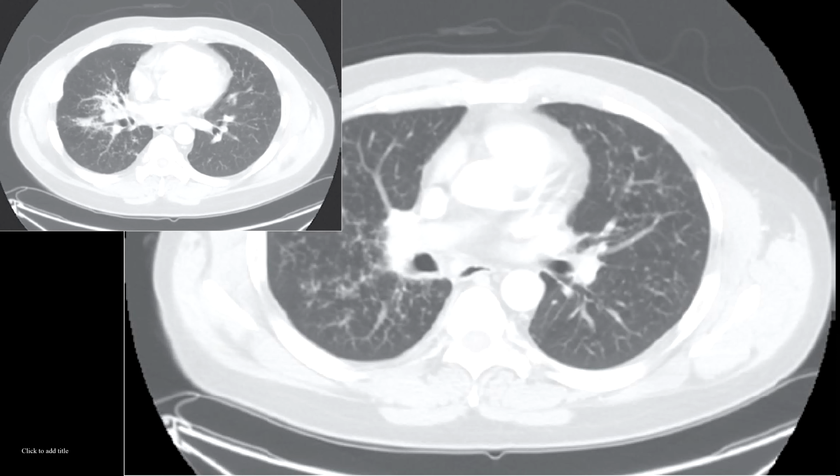I would want to review the entire CT scan to assess the extent of disease, the presence of lymphadenopathy and the presence of fibrosis. I would like to discuss the case with the clinician, and a referral to a chest physician is required. A search for other foci of disease should be performed. Pulmonary function tests should be performed. The serum angiotensin-converting enzyme should be measured. The combination of the histological finding of non-caseating granuloma and the absence of acid and alcohol-fast bacilli on biopsy samples is the gold standard for the diagnosis of sarcoidosis.